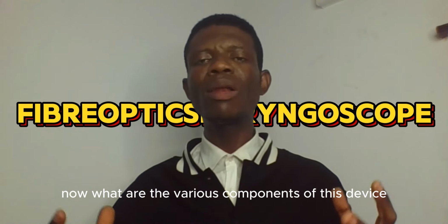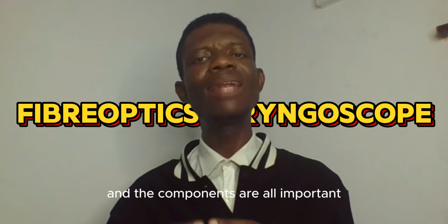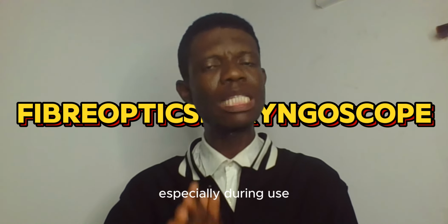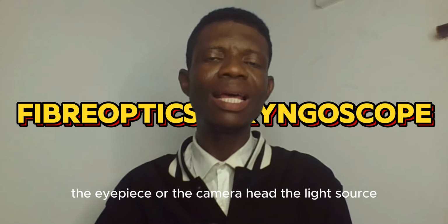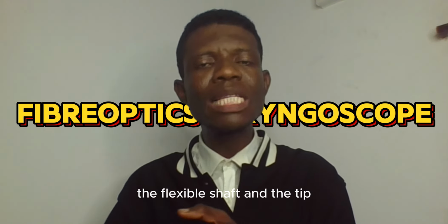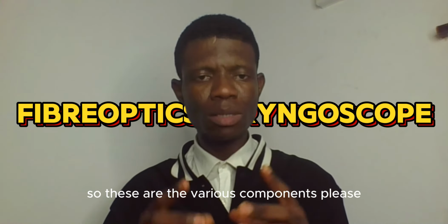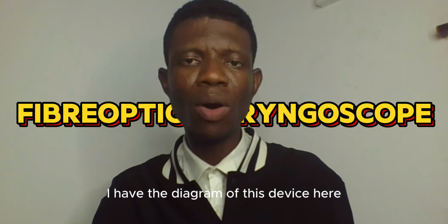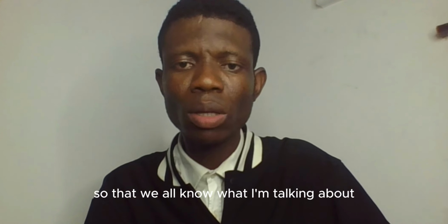Now, what are the various components of this device? This device has a lot of components, and the components are all important, especially during use. The first one is the control knob, the eyepiece or the camera head, the light source, the flexible shaft, and the tips. So these are the various components. Please, I have the diagram of this device here. Let me bring it out so that we all know what I'm talking about.